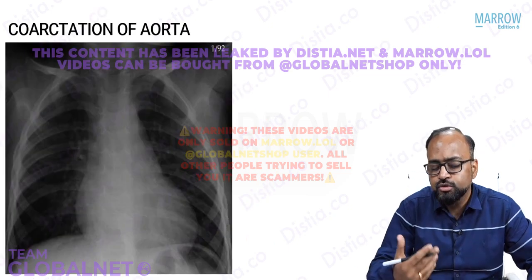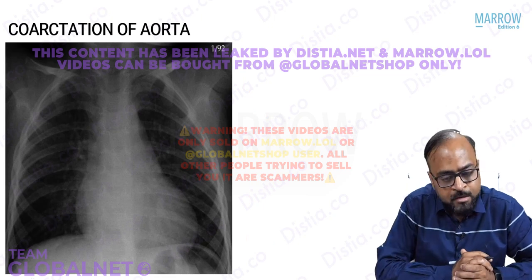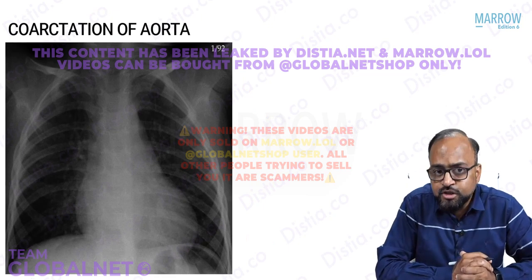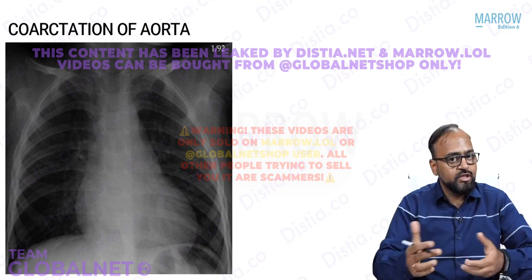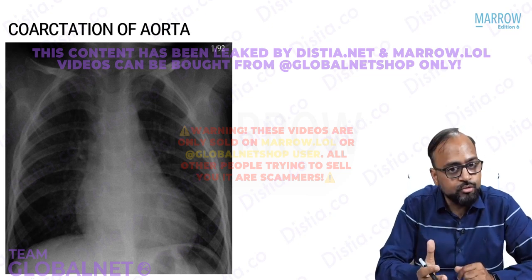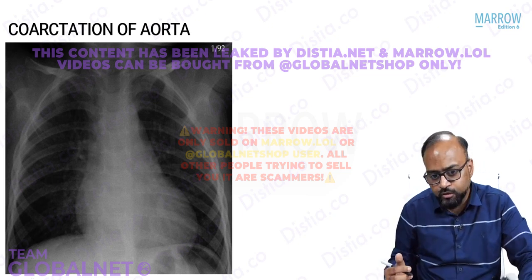Direct visualization. So, see the investigation of choice. Chest X-ray can offer certain indirect signs, right? The investigation of choice usually for a diagnosis of coarctation of aorta is a CT angio or an MR angio. The gold standard is usually going to be a catheter angiography. Now, what do you see here in this particular radiograph?